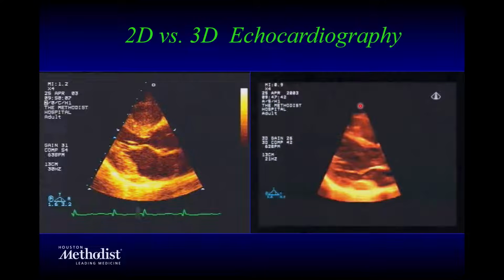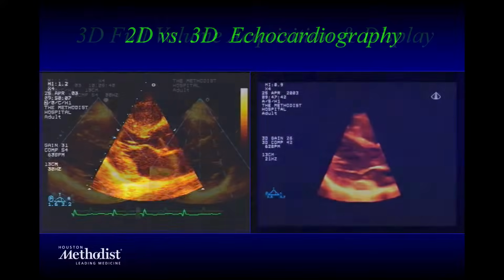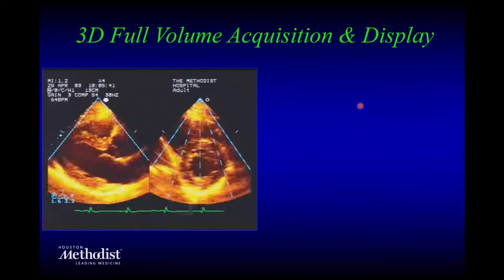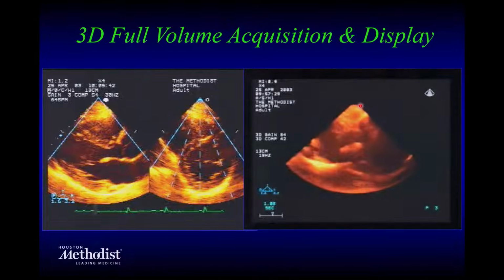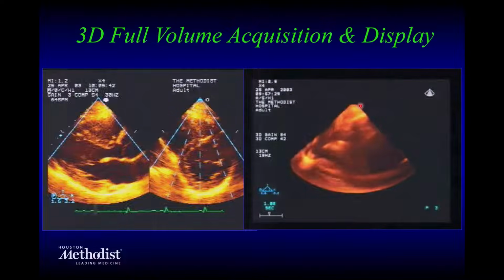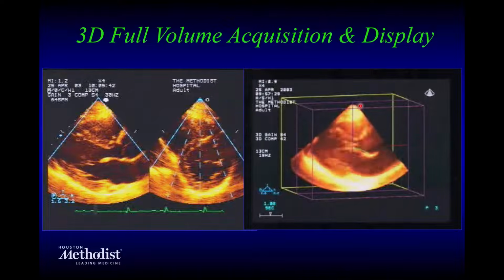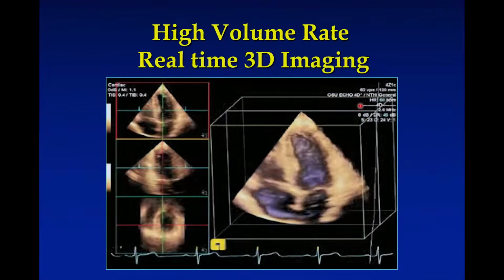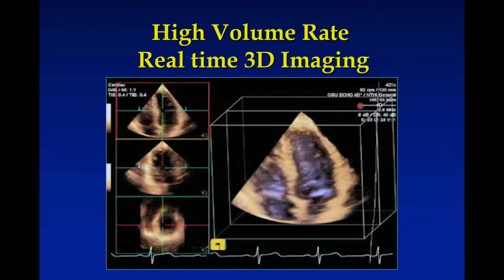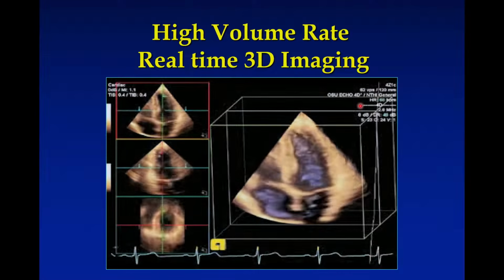This is just a reminder for me, and I left these in 2003. This is the beginning, so we are almost at 20 years, and the images were not bad to start with, and it's really amazing. So yes, this is the full cone, if you will, of 3D image, and you can cut through it and go all the way, and images have really improved so much since that time. It is very nice. The frame rate has improved so much in 3D volumes.